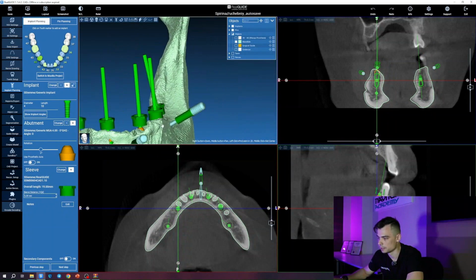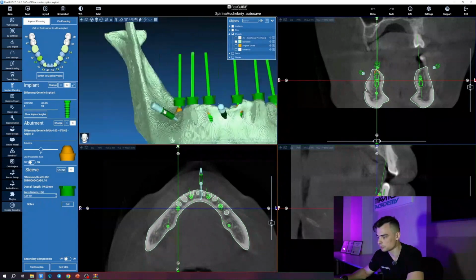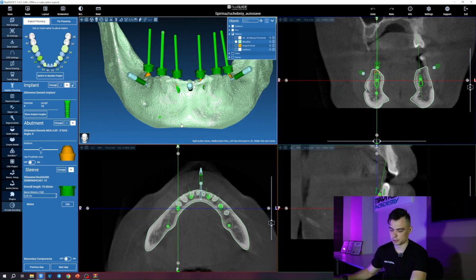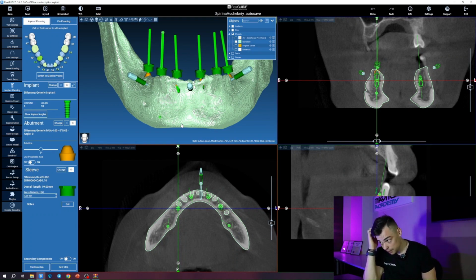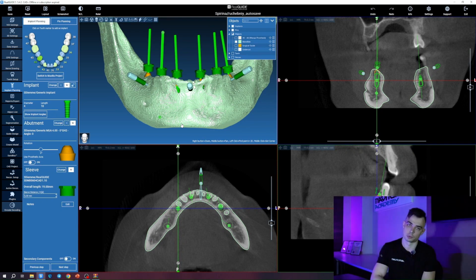So now let's see what we have here. For the people who come to these walls, and for you as well, I'll talk about segmentation in general, about working on these kinds of segmented jaws, that is working with bone. According to some authors, and you've probably noticed this in your own practice, we trust computed tomography and base all our calculations on it. But according to some authors who specialize in radiology, the margin of error in computed tomography can vary both upwards and downwards. And this margin of error can reach up to 1.5 millimeters.